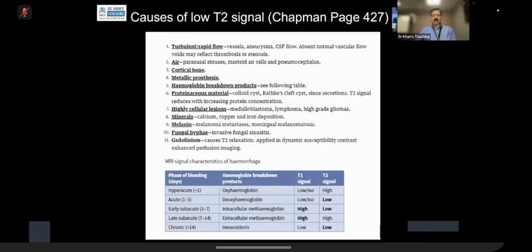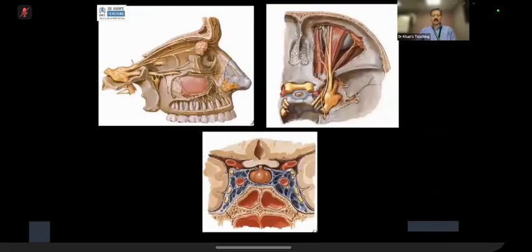Now, the hemorrhage part we have covered. The history was right-sided trigeminal neuralgia. The patient just presented with this, and they thought that something is happening because it was right-sided. And they did this scan. Initially, only a CT was done, and this lesion was, of course, not picked up there. Now, the anatomy is Meckel's cave.